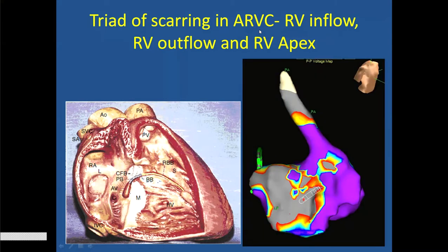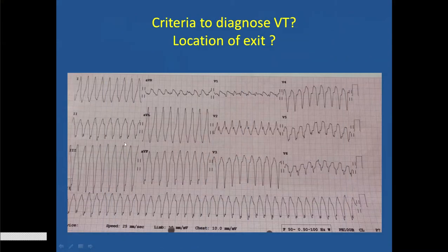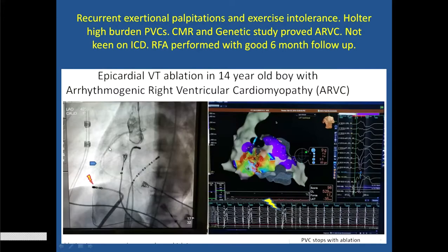The same patient had another morphology with a different QRS complex, still apico-inferior, but with an RBBB, which means it is exiting towards the left side also. So the scar can exit left or right if it involves the septum. ARVC can also involve the left ventricle in a significant minority. And again, aVR is positive. The lead 2 criteria, in some other ECG I will show.